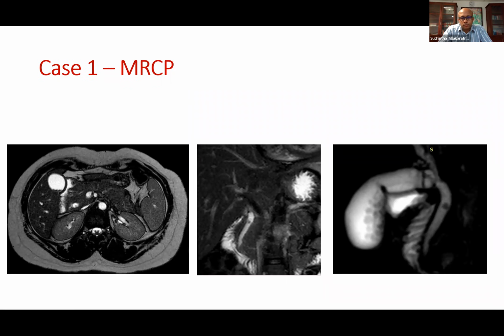Yeah, that's quite correct, because MRCP is about 10 to 15% more accurate than CT to diagnose calculi, because some of the biliary calculi are radiolucent, especially the cholesterol calculi, which are not radiopaque. You might not be able to pick it up even on CT. But looking at these images, it's quite clear that you can see a signal void in the right-hand corner image, which is called the 3D image. If you're lucky, if you have very good images of this quality, you might be able to pick up a CBD calculus, which is in the mid CBD, not in the distal CBD. But you can still see some filling defects within the gallbladder itself as well.